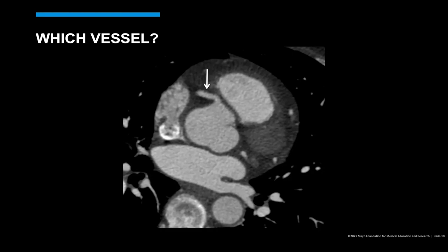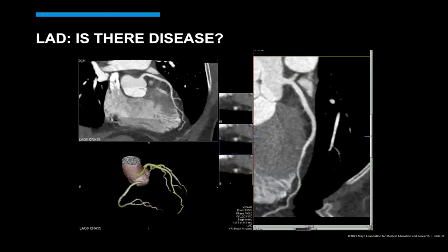And they might not always ask you to identify the anatomical structure in a conventional orientation. So it might not always be a straight axial slice. It might be a sagittal image. It might be coronal or even obliquely oriented. And there'll be a few questions here today that ask you to identify normal anatomical structures. Okay, so here's the next question.